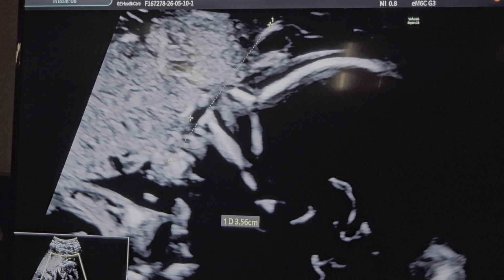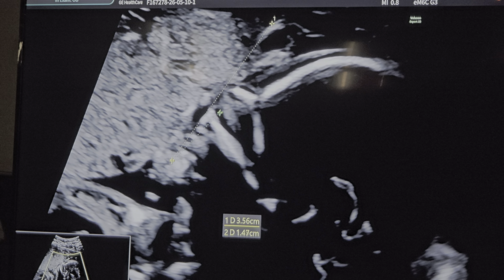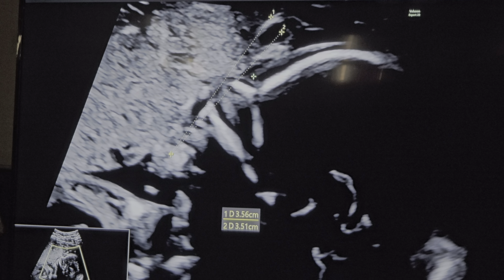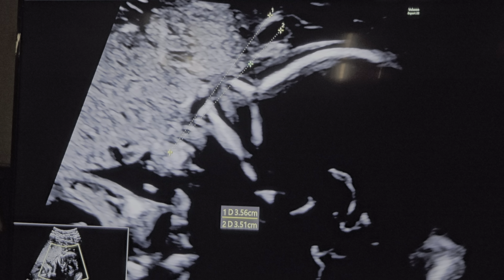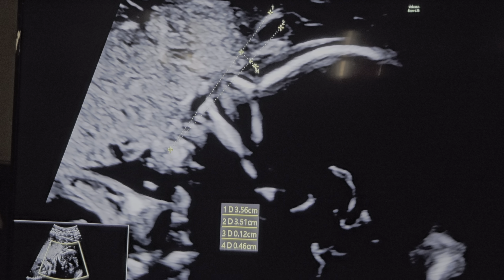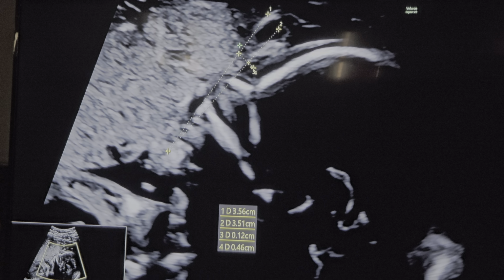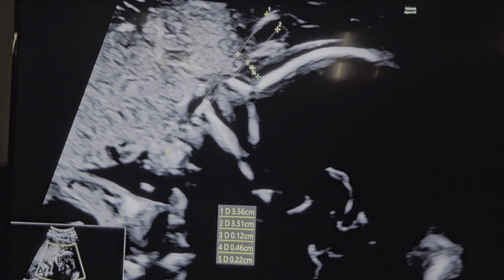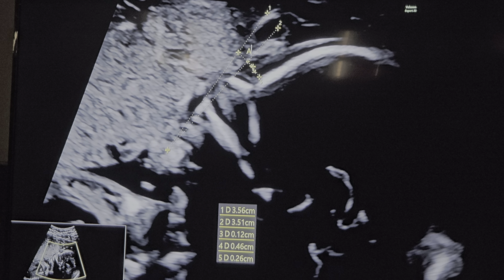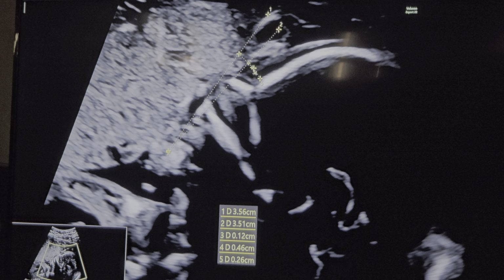So what will be this line in Down syndrome? It will be like this. Easy? So the gap between the skin and this line will be less, whereas the gap between the skin and this line is more now. Simple concept. So take that ratio and measure the skin thickness. Give that ratio as A and the skin thickness as B and take A bar B. Confusion? No.